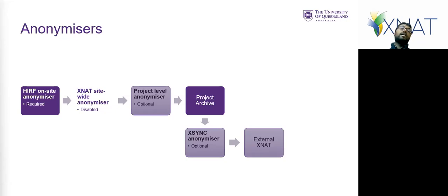XNAT has a site-wide anonymizer that enforces anonymization across all data uploaded onto it. And we do not enable this on the UQ XNAT, so this does not run. If you see documentation about site-wide anonymization, this doesn't apply to the UQ one. Optionally, you can use a project level anonymizer, which can edit DICOM tags before they're archived into the project. And there's also a separate anonymizer for XSync, which is a plugin that lets you sync from XNAT to XNAT.